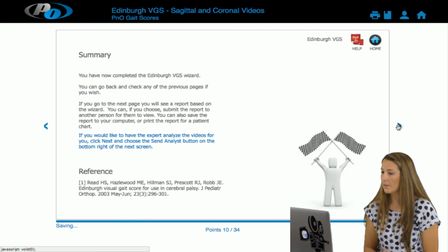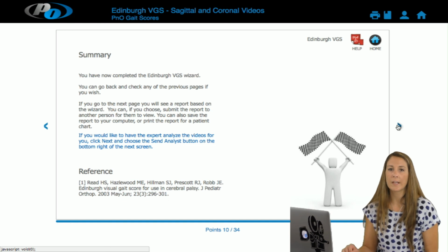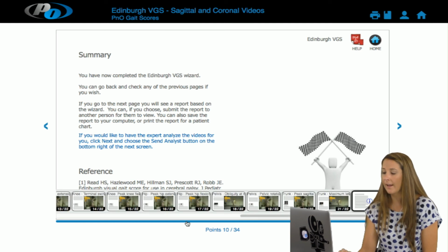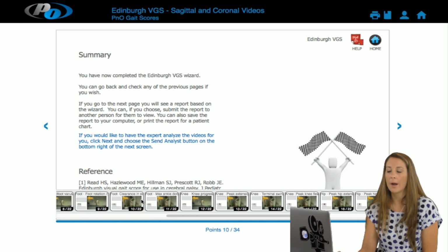Okay. So now we're at the end of our report. You'll see the summary page. Again, if you did want to use the expert analysis for the videos, you wouldn't have had to do any of those. You would actually only do the first few slides, which tell us about the body segments, and then loading the videos, and then you can skip ahead to this. If you ever want to go back through and look at anything, you click at that progress bar at the bottom, and you can actually go through and find what measure you had done before.